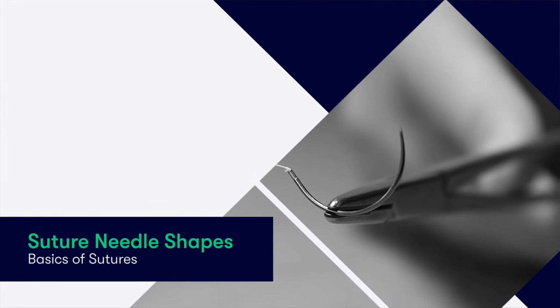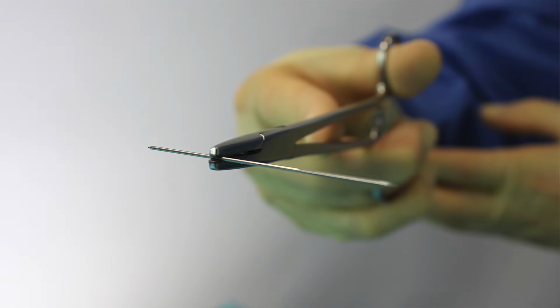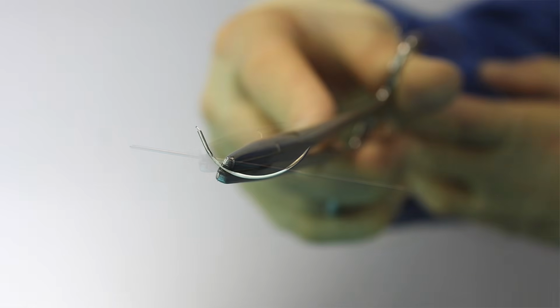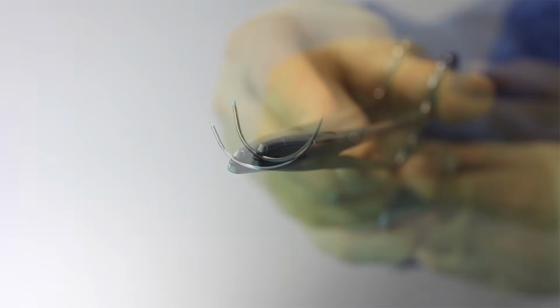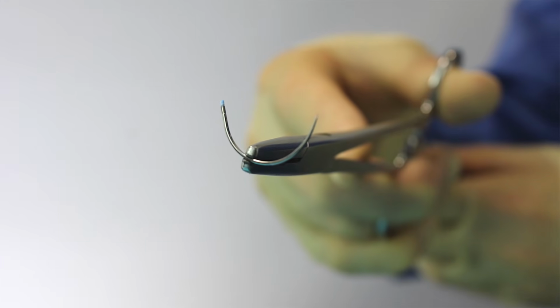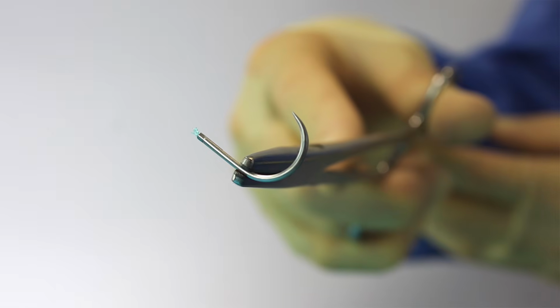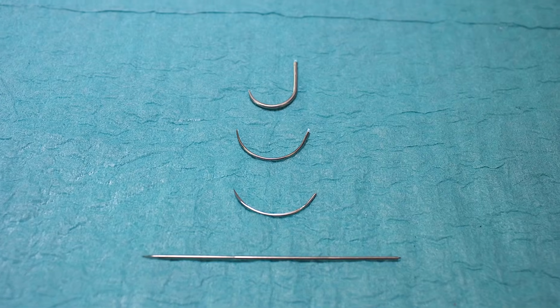In terms of the shapes of needles, there are key ones that you need to be aware of. They may be straight, 3/8 the circumference of a circle, half the circumference of a circle, or J-shaped. Their different shapes dictate their different uses.